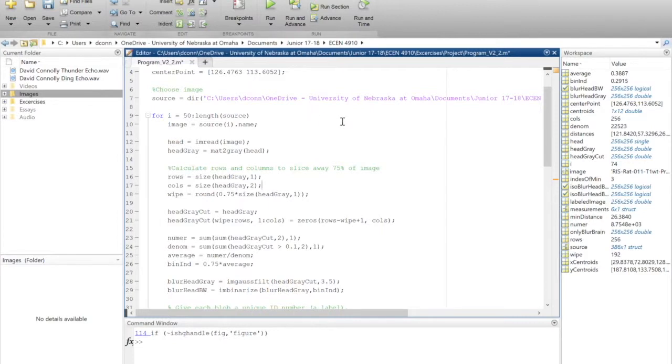Today we will be discussing the contrast approach to extracting a rat's brain from an MRI. The program that uses the contrast approach is all within a for loop. The for loop runs across each slice of the MRI, starting at slice 50 until the end. Slice 50 is where the brain starts to become noticeable.